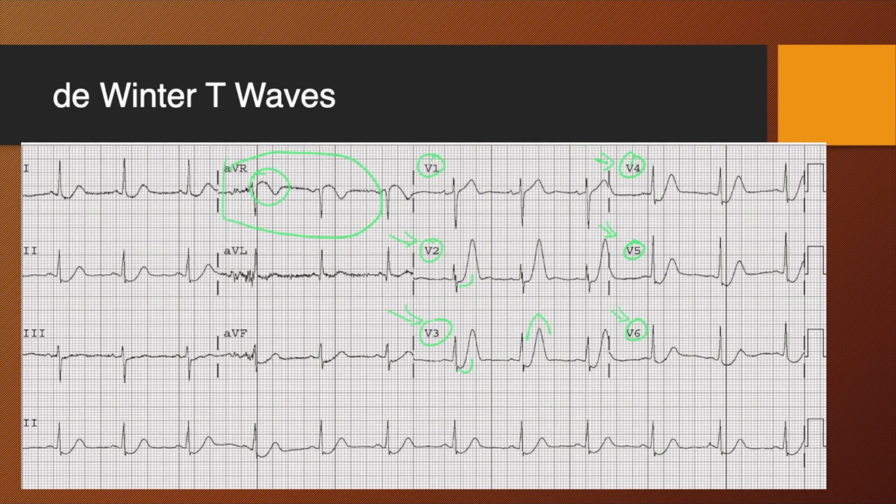This is not an NSTEMI, right? This is not NSTEMI. This is OMI. This is likely an occluded left anterior descending artery, and this patient needs to go to the cath lab.